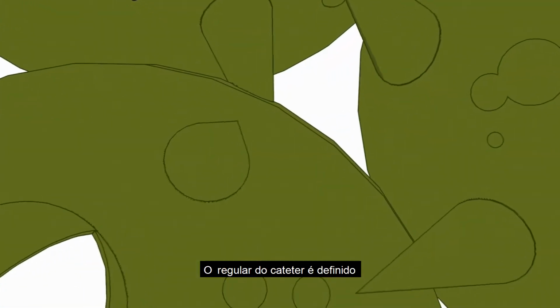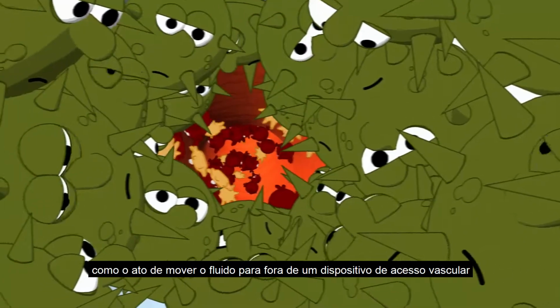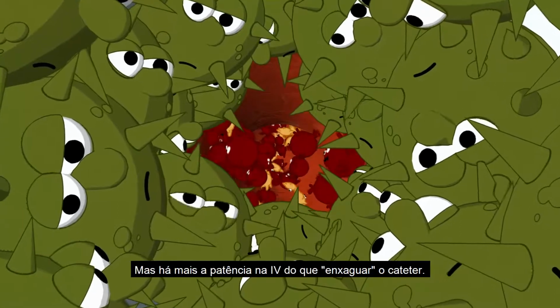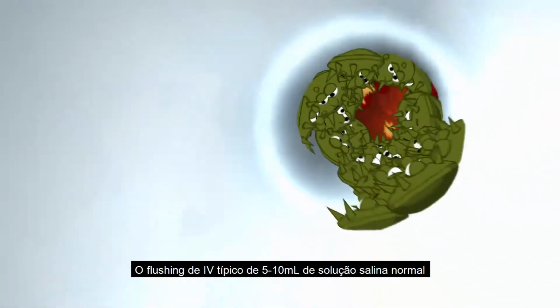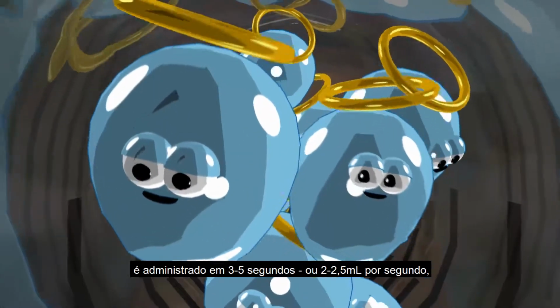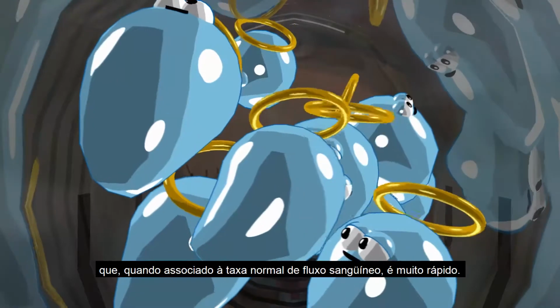Regular flushing of the catheter is defined as the act of moving fluid out of a vascular access device and into the bloodstream to assess and maintain patency and prevent drug precipitation. But there's more to IV patency than rinsing the catheter. Let's have a closer look. A typical IV flush of 5 to 10 mL of normal saline is delivered over 3 to 5 seconds, or 2 to 2.5 mL per second, which, when compared to the normal rate of blood flow, is very fast.